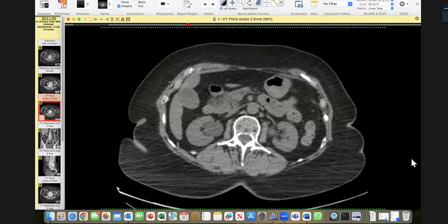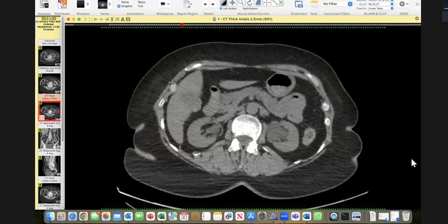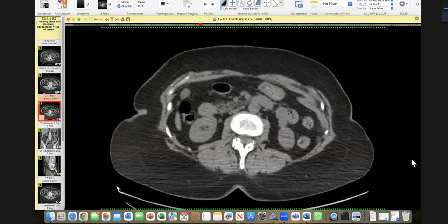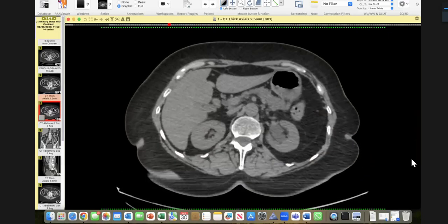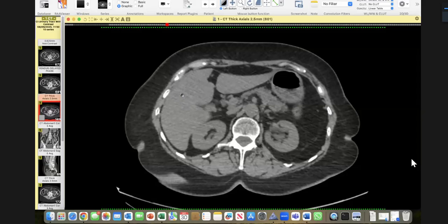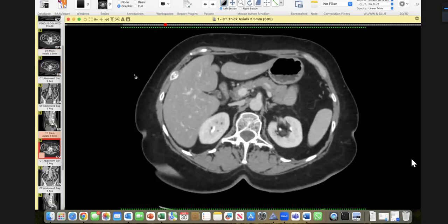which I don't think so. I'd like to know if there are post-contrast images to examine to see if these are enhancing lesions. Yeah, thank you.